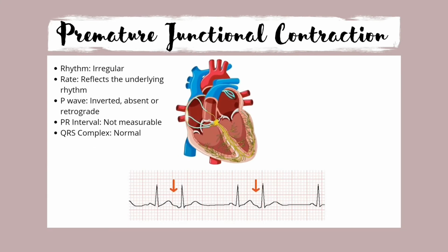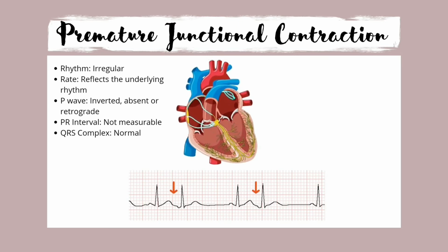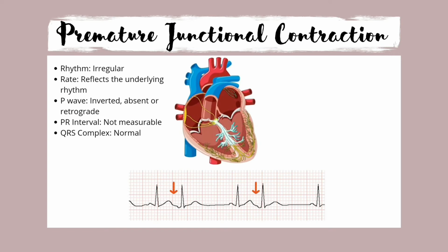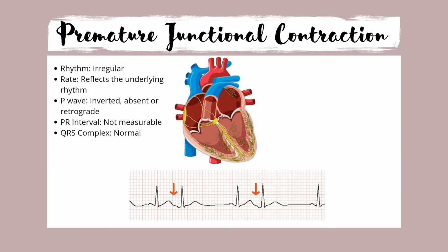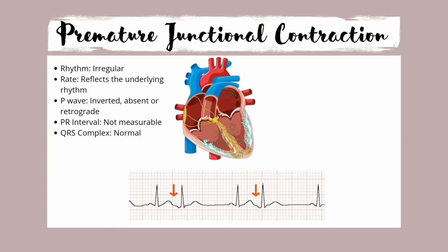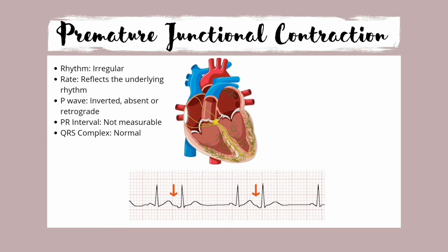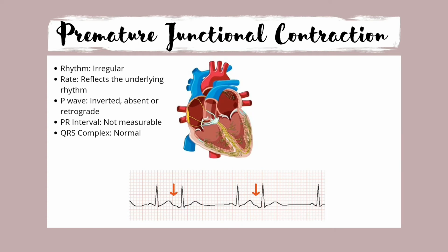Premature junctional contractions (PJCs), also called atrioventricular junctional premature complexes or junctional extrasystole, are premature cardiac electrical impulses originating from the atrioventricular node of the heart or junction. This area is not the normal but only a secondary source of cardiac electrical impulse formation. These premature beats can be found occasionally in healthy people and more commonly in some pathologic conditions, typically in the case of drug cardiotoxicity, electrolyte imbalance, mitral valve surgery, and cold water immersion.